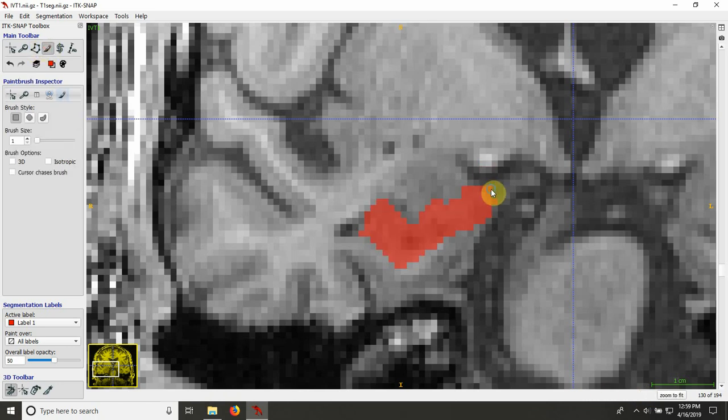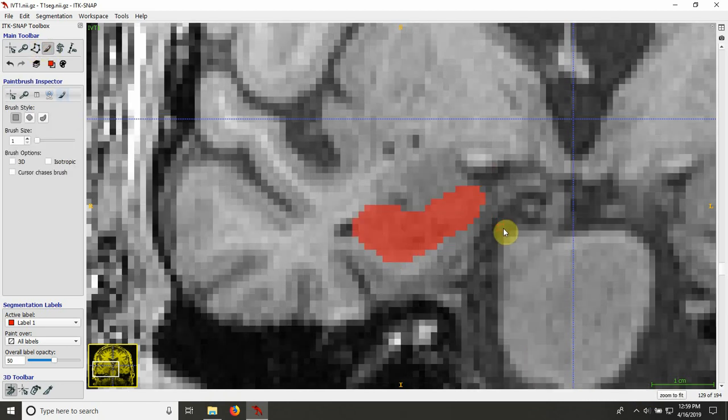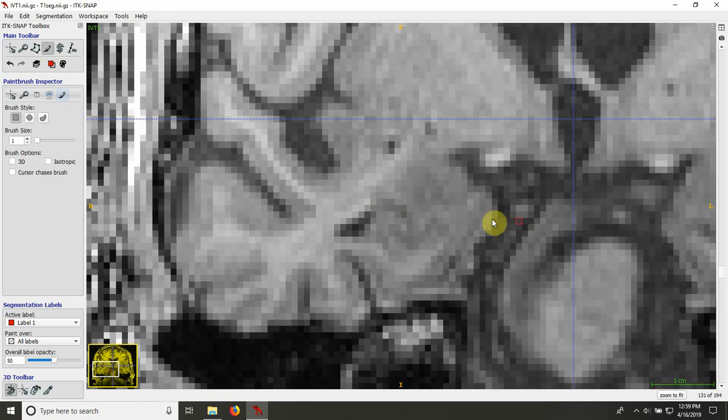A little over segmented on this end. So what happens now is I see the white matter border here, the CSF border, some darker voxels here. I see the bright voxels here, which are in contrast with these darker amygdala voxels, and I also see some bright voxels there. So I think the hippocampus doesn't go all the way to the end of the cortex here. I think this is entorhinal cortex, and the hippocampus is in the middle of the MTL now. So that would be my border.